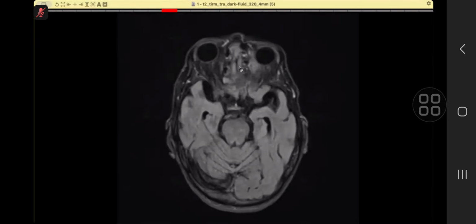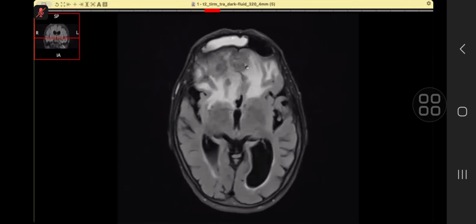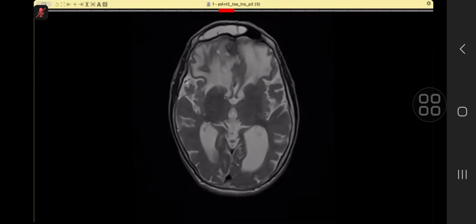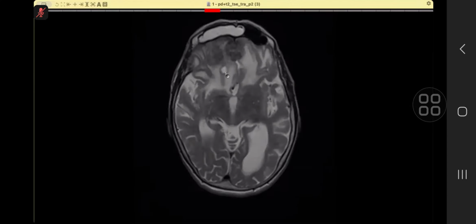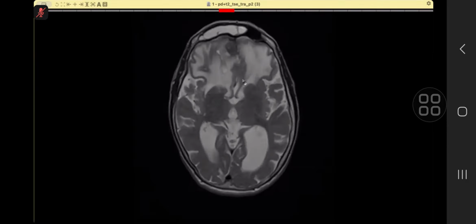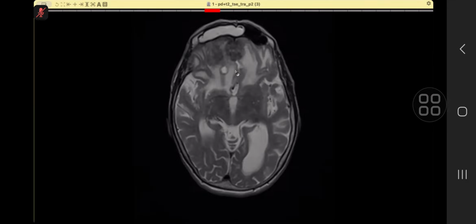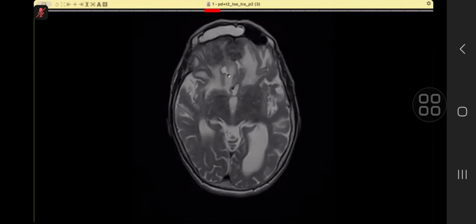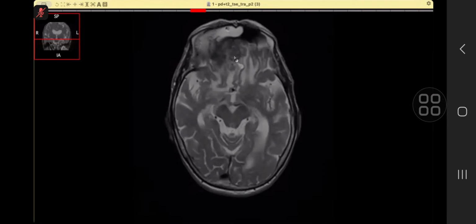So this is the lesion. And here, where I am pointing out, are there any cysts? Yes, there are. Do you see these cysts? If I go back to the FLAIR, here you are, this low signal, confirm it on a T2 weighted sequence. And what did you read? You read that, in the intracranial component, peritumoral cysts are characteristic, is the word which is used.